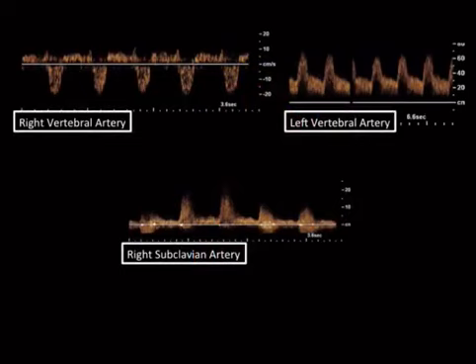So here we go. Here is a classic. Anytime you see vertebral artery in a Doppler question on multiple choice, there's only one answer, and it's this. It's subclavian steal. And you've got reversal here. But without even seeing that, you know that when I say vertebral artery Doppler, you say subclavian steal. That's the only thing that they're possibly going to show. I say vertebral artery Doppler, you say subclavian steal.